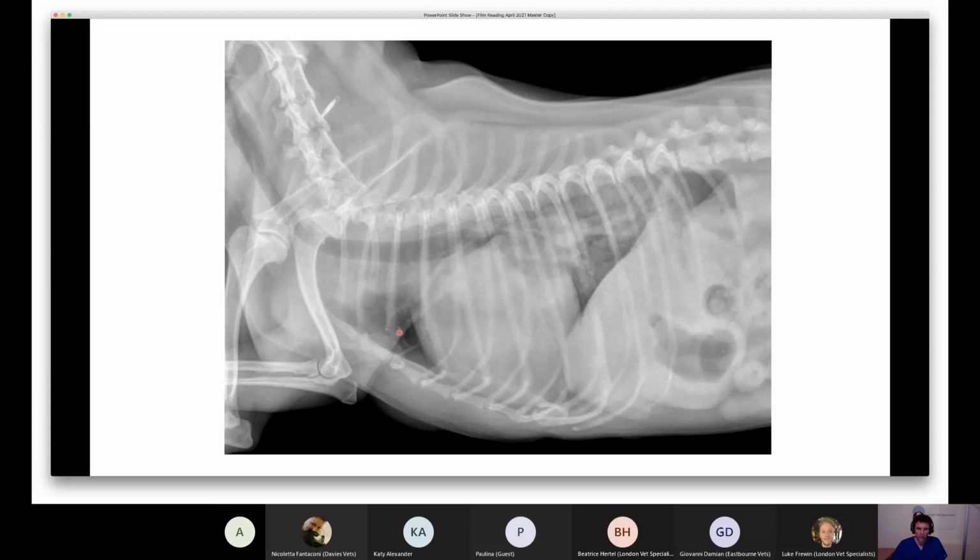Quite often, I've seen patients like this present and have some frusemide before they get their radiographs. And I think in those patients that are in kind of early failure and have already had a bit of frusemide before they get their imaging done to try and stabilize them, often these vessels look normal by that point. And I think B's right. I wouldn't really ping these pulmonary veins as being too big and bigger than the pulmonary arteries. So there we go. I don't have anything else to add.